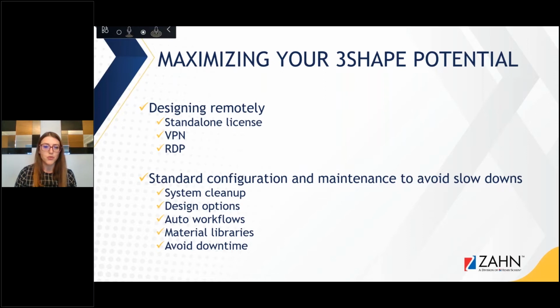And then we're going to go over some standard configuration and maintenance of your 3Shape software that you can use to speed up how your software works in the office, but it's going to be especially more important if you're designing remotely because you want to minimize any types of slowdowns when you're having a connection that's not in the same office that can cause issues or delays.